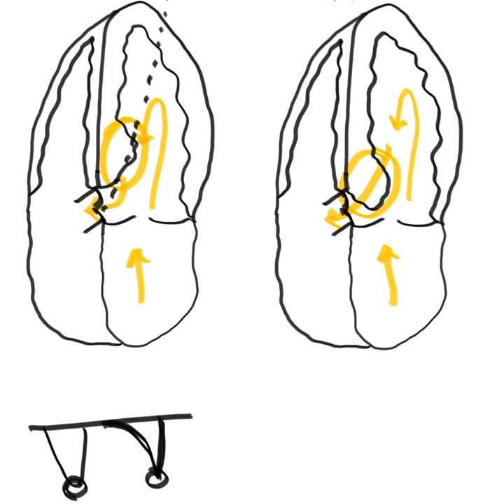And that's because as this ventricle squeezes and squeezes and squeezes, the LVOT right here gets narrower and narrower due to the thickening of the wall here. And so as this space gets tighter and tighter, as the LV squeezes, you have a faster and faster velocity as systole continues on. So you get your highest velocity at the end of systole.